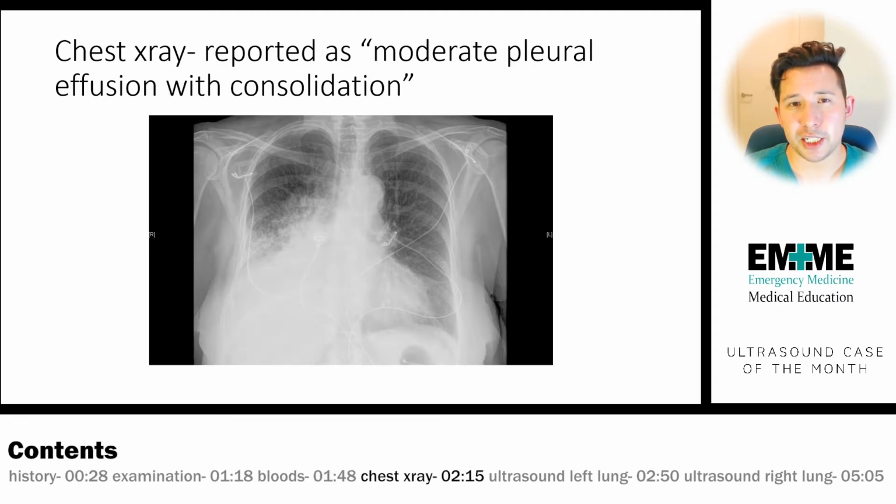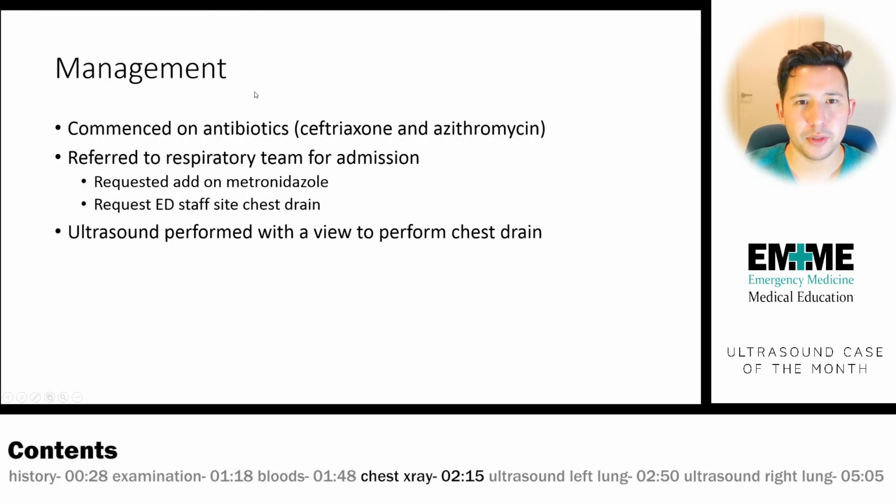She had this chest x-ray, which was reported as showing a moderate pleural effusion with consolidation, and you can see the large area of opacification at the right base.